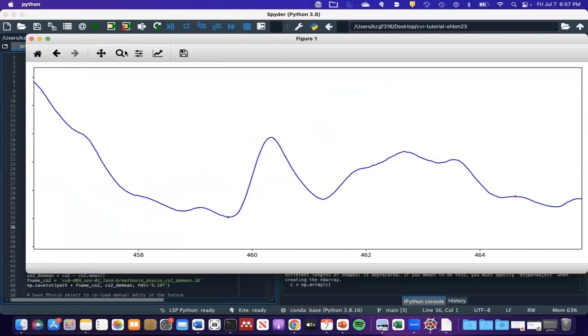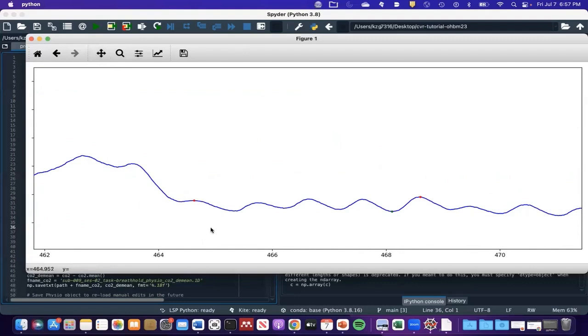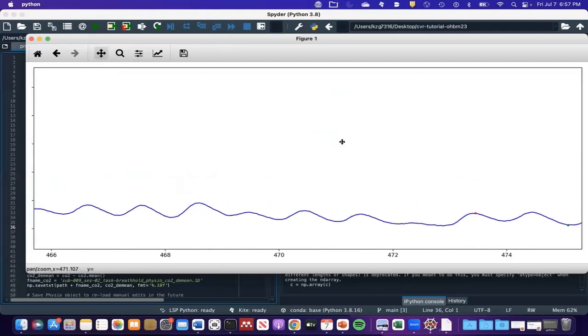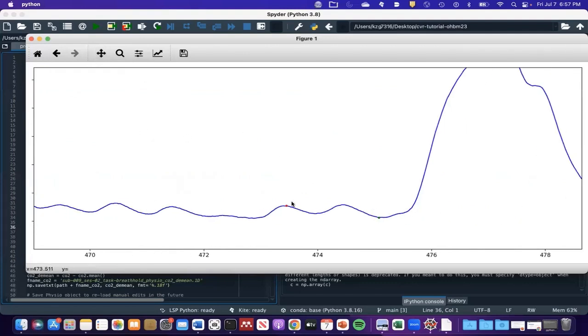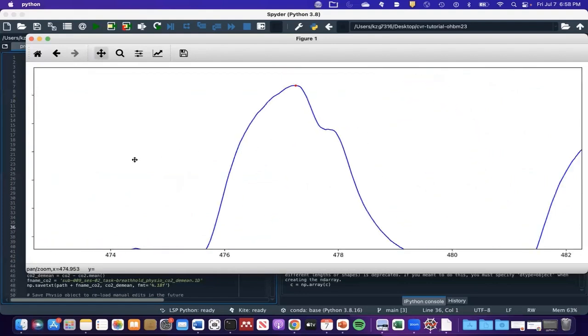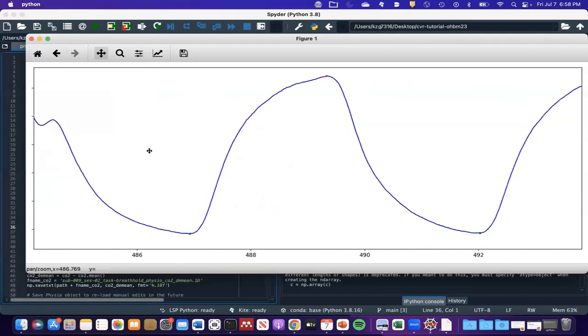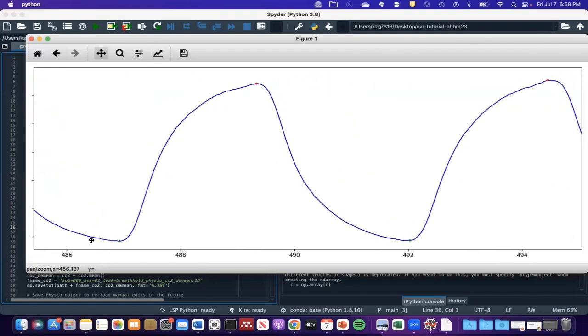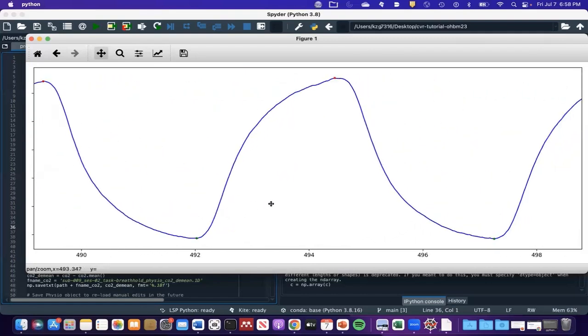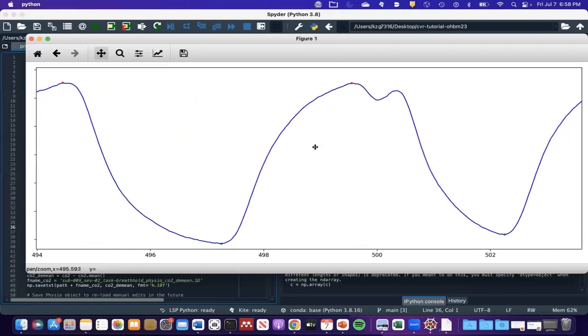So we will run this line, and then this is the file name we want to use, and then we'll save it in that folder with our sample data. And oh, it looks like those lines didn't run because I didn't quit this GUI. So now we have saved our file, which tells us where in the CO2 trace are our end tidal peaks.